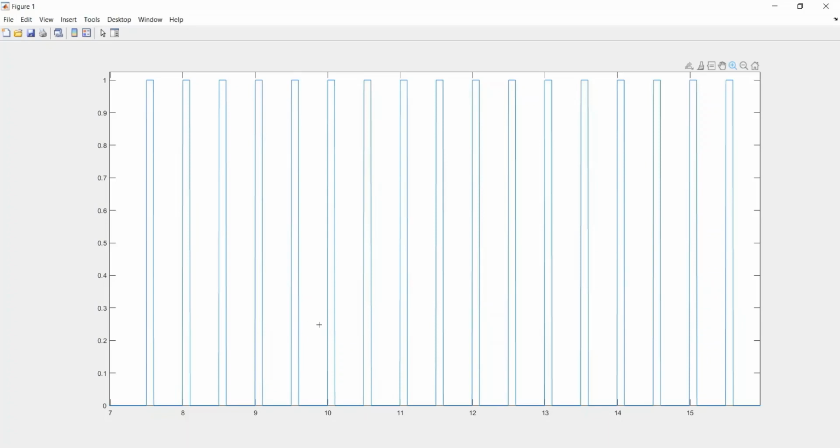I have shown you an image while explaining auditory stimuli. This is the output of a similar auditory stimulus, in which you can clearly see that it is repeated twice in a second. So it is a 2 Hz auditory stimulus, and a similar kind of stimulus has been presented here. I think this is a realization of what I showed, which we made using PsychoPy.